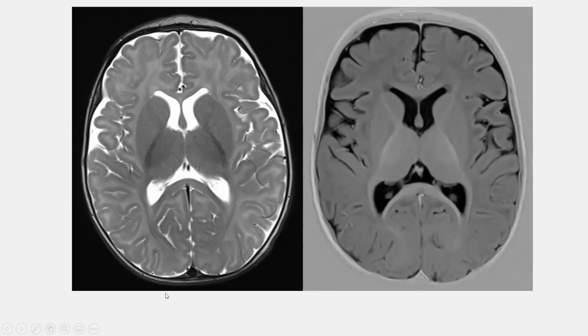And then let's look at the T1 weighted images, and even without examining in detail what is myelinated and what not, visually and at a glance, we clearly see a difference. We would estimate this brain to be more myelinated compared to the brain on the T2 weighted images, but it's the same brain. It's the same degree of myelination. So how is this possible? Why does myelination look a lot less extensive on T2 weighted images compared to T1 weighted images?